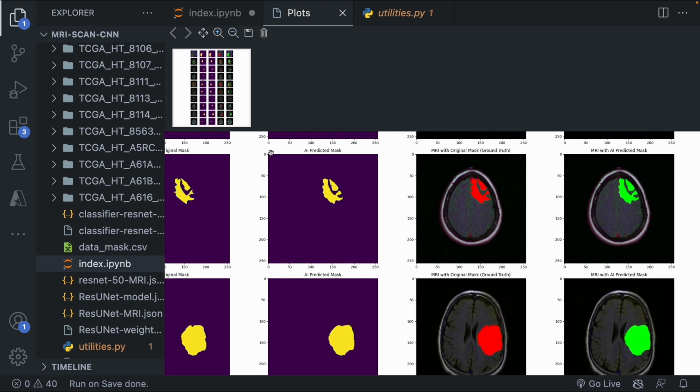I believe you've learned a lot from this tutorial. Now what I want you to do is to transfer these skills to build more projects, or even modify this one to perform much better. I recommend you work on other images like breast cancer or any other image classification tasks at the pixel level.